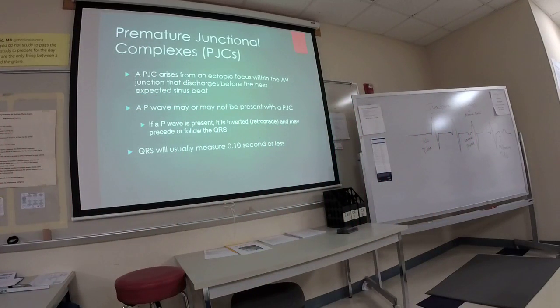That P wave's inverted because of time. There's a time lapse there. There's a problem with the conducting system. And expressly a time problem is when the P wave follows the QRS complex.